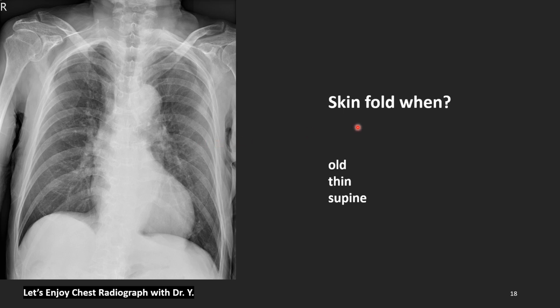Let me see. Skin fold is famous in old people and thin people, and especially in the supine film. In other cases, it is not a problem. Old, thin, supine film.